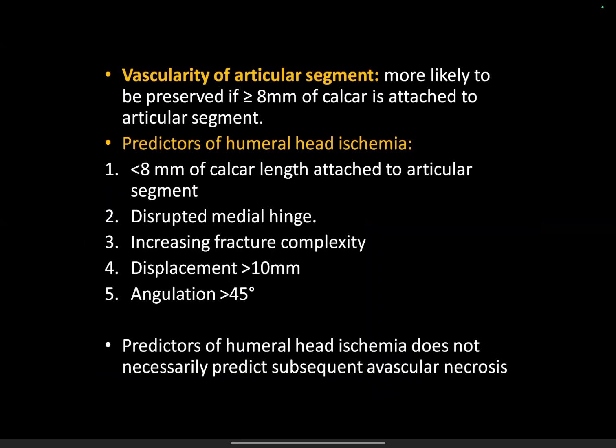All right. So vascularity of the articular surface is more likely to be preserved if my fracture line was found more than 8 millimeters from the articular surface.